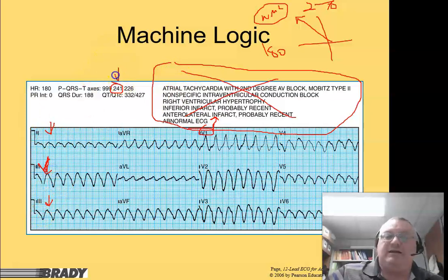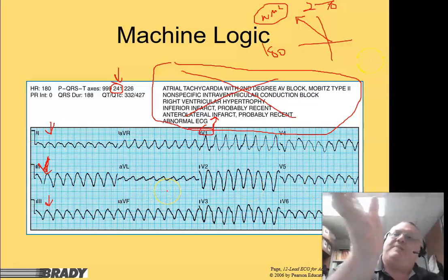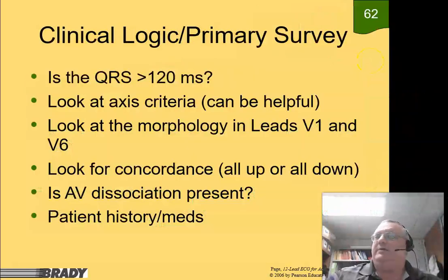You know that this right here is going from the ventricle up, up. That's the direction of travel. It's coming from the bottom of the ventricle back towards that atrioventricular line. Yeah, this is VTAC. There's no doubt about it in the world, okay?